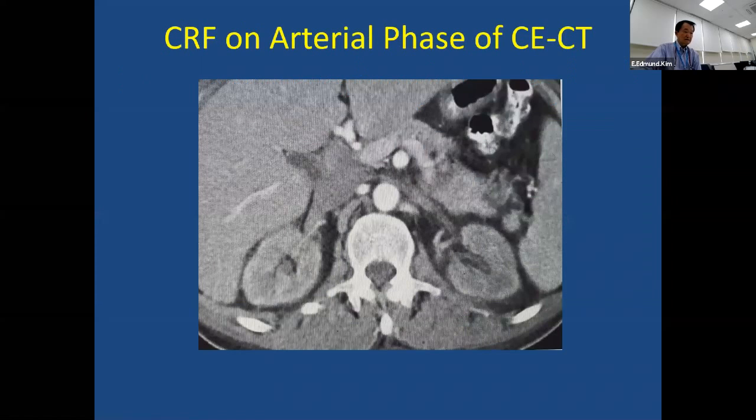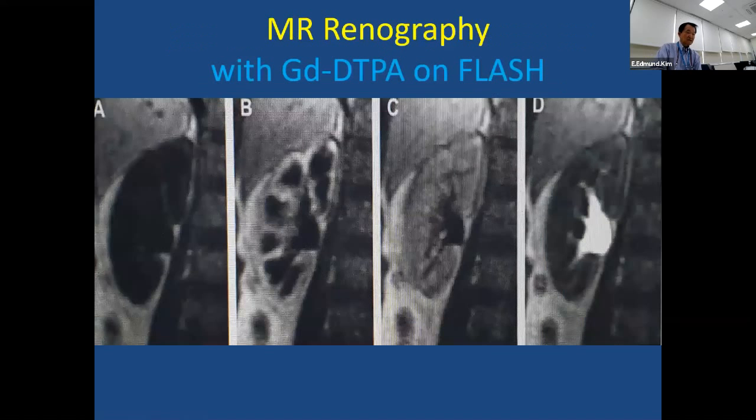And you can see again, this is an arterial phase. You expect to see a good nephrogram or corticomedullary differentiation, you don't see it. You'll find some mass or something here. So it's a renal disease suspected. This MR again shows the collecting system, but a very thin cortex.